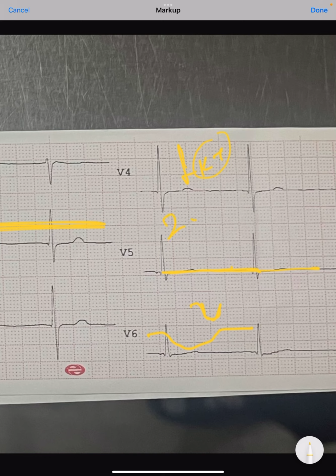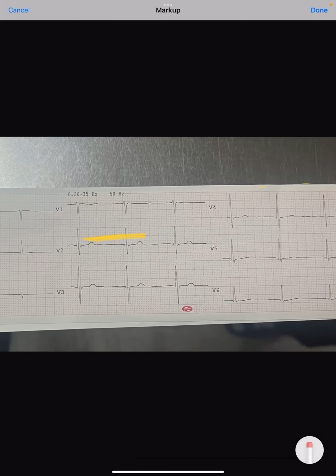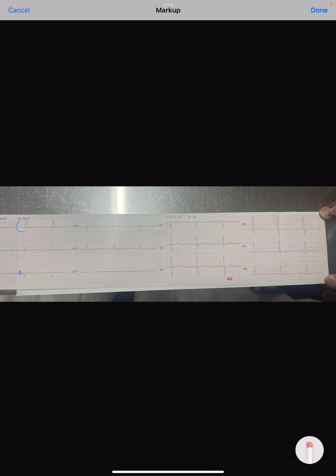In this particular patient, the potassium was 2.8 milliequivalents. Normally it should be between 3.5 and 5.5. So any ECG having a flat T wave, or inverted T wave, or ST depression, or low voltage complexes, you should always think of hypokalemia. So flat T wave, or T inversion, or ST depression, and the last one is low voltage ECG. These are very typical changes of hypokalemia that we should always consider and should always be corrected.